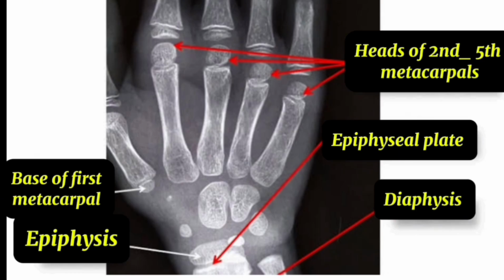Heads of second to fifth metacarpals. Epiphyseal plate. Base of first metacarpal. Epiphysis.